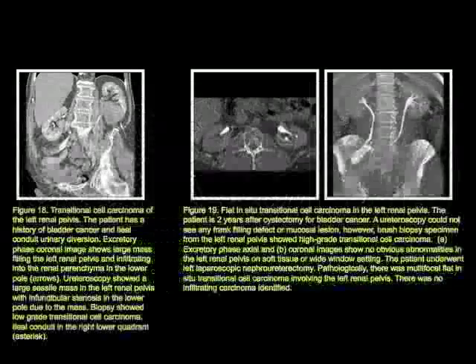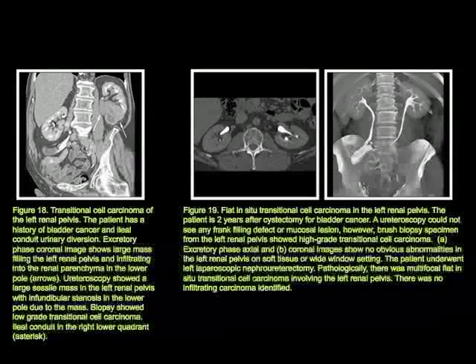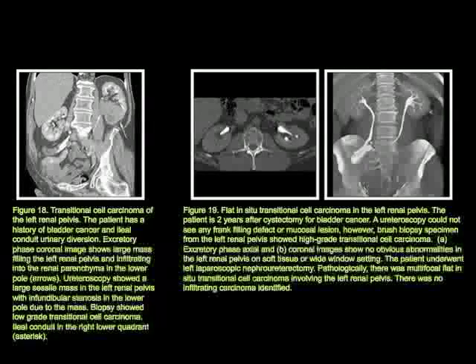And again, it's just another example, transitional cell carcinoma of the left renal pelvis on your left. And another example of a subtle renal lesion in the left renal pelvis. So again, small and large lesions, but you need to be monitoring very carefully. And when you monitor these patients, think about the complications from infection to urinomas, seromas, to tumor. Tumor you're not going to worry about early, but I did show you a case 4 months later. So again, something to consider.